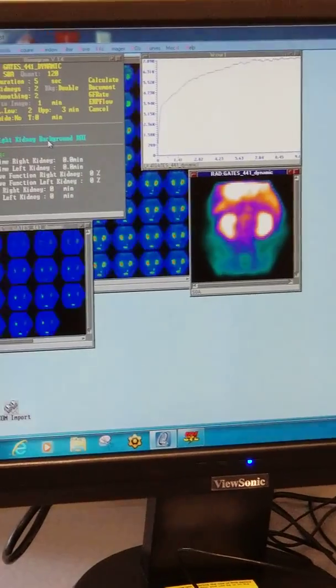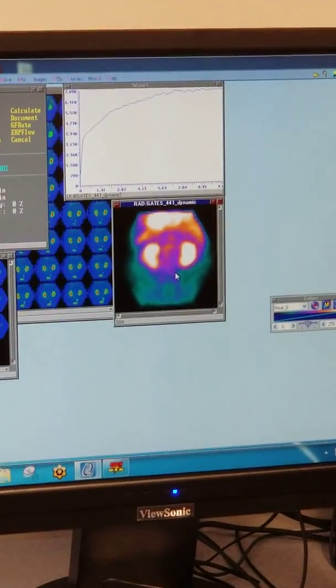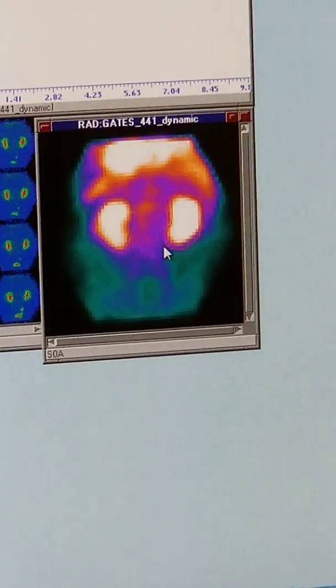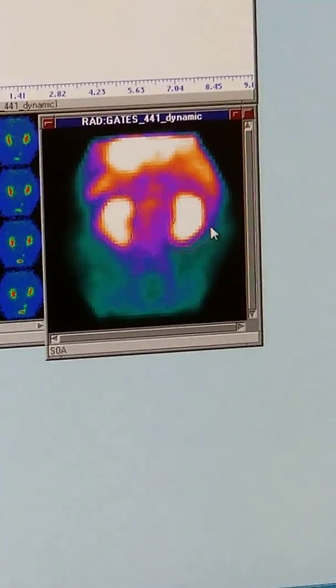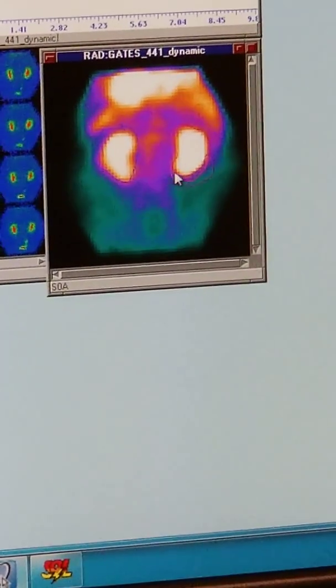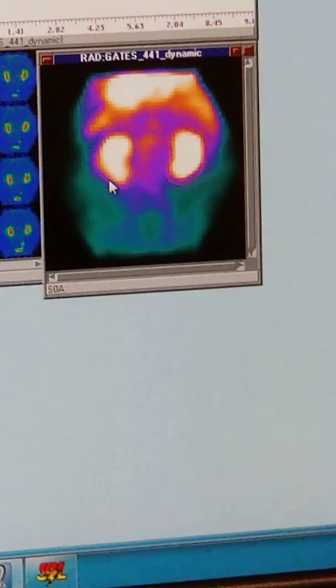Then it's going to ask for your background. And just like before when you did the cardiac, nice and tight. So you're about from here to here. Oh, that one's too big. But y'all know what to do. Right kidney, we click. And then here the same.